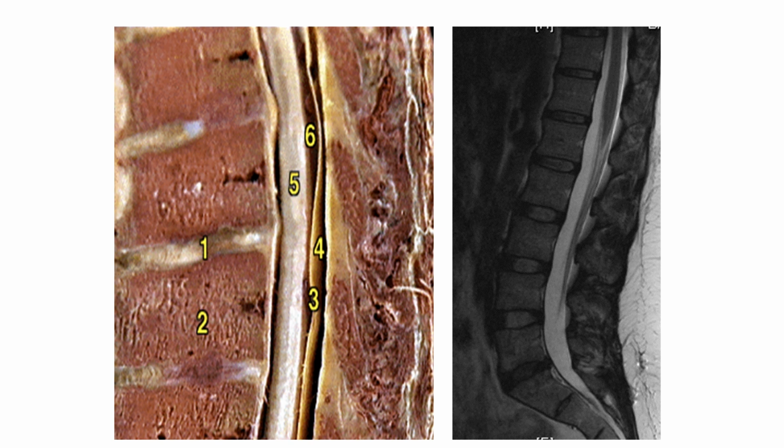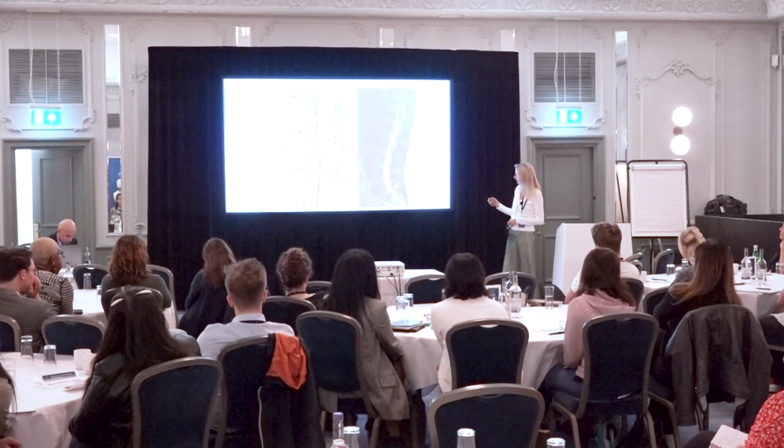You can see the spinal cord up there, and this is a T2 scan, showing you the spinal fluid, which is white on a T2. Fat is also white on a T2. And you can see that the discs, when they're nice and hydrated, are white and plump. As you get older and get more wear and tear, they become more desiccated.